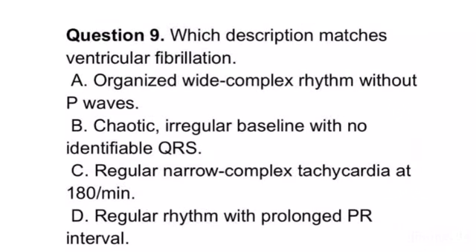Question 9. Which description matches ventricular fibrillation? A. Organized wide complex rhythm without P waves. B. Chaotic, irregular baseline with no identifiable QRS.